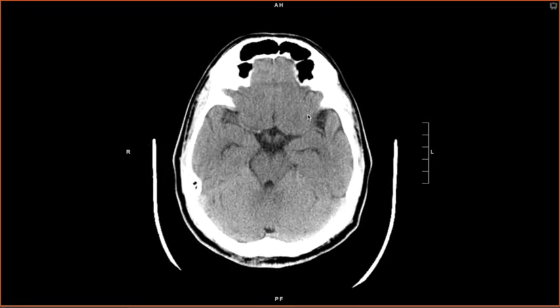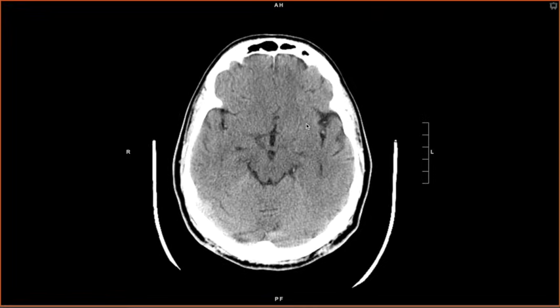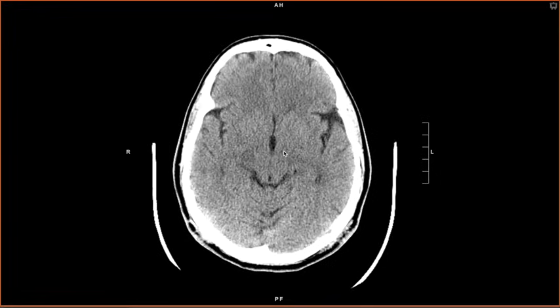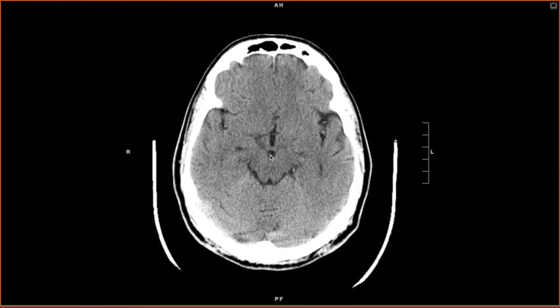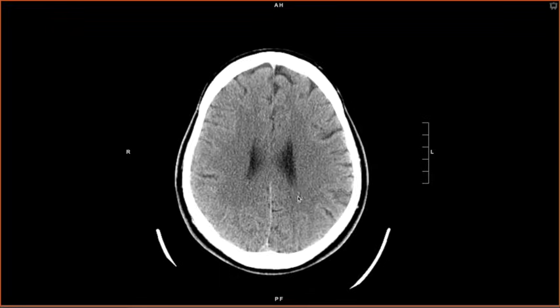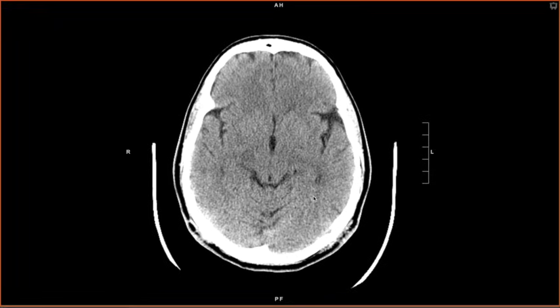Blind spots for blood are more subtle and often in the dependent portions of the brain, such as the interpeduncular fossa. Right here, you can often see very subtle hemorrhage there in trauma. In the Sylvian fissures here, in the most dependent portion, you can often see hyperdensity there, representing subtle blood. And also in the occipital horns of the lateral ventricles, you can see intraventricular blood.